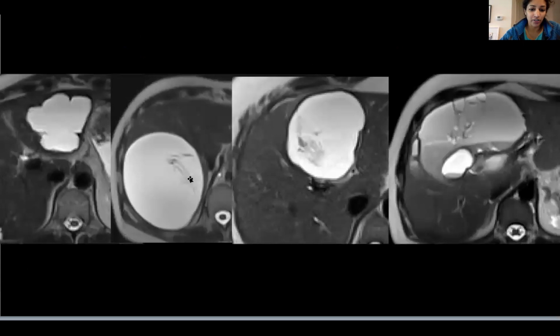They're usually multiple. This also turned out to be a hamartoma. So there can be an overlap between a biliary hamartoma and a mucinous cystic neoplasm. But in a middle-aged, especially female, think about an MCN. And then when it has locules and true septations to it, definitely think about an MCN. Although the ones in the liver actually tend to do better than the pancreas ones, and a lot of them just have low-grade dysplasia.